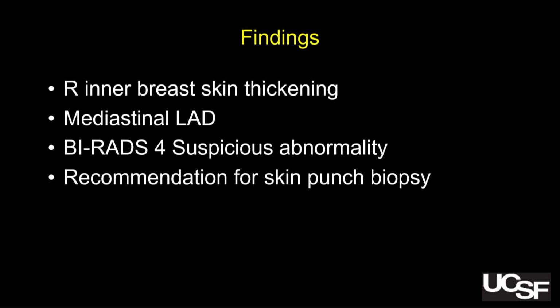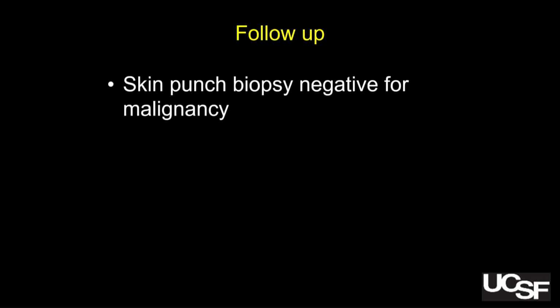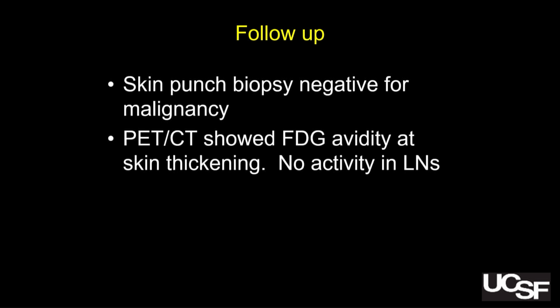And we actually recommended skin punch biopsy because we figured this is clinically apparent. And even if it isn't, it's a really large area. We can just tell the surgeon where to go. So our surgeon did do a skin punch biopsy. It was fortunately negative for malignancy. We also did a PET CT because of the mediastinal adenopathy and the skin thickening. So there was some avidity at the skin thickening site, but the lymph nodes were not hot at all, which was great. So probably just reactive.